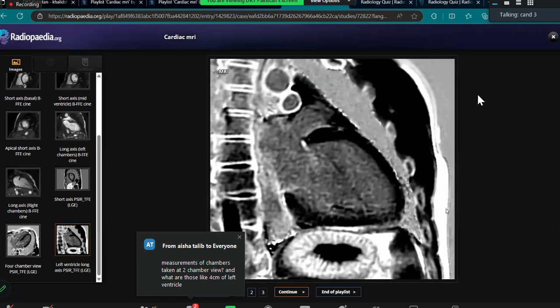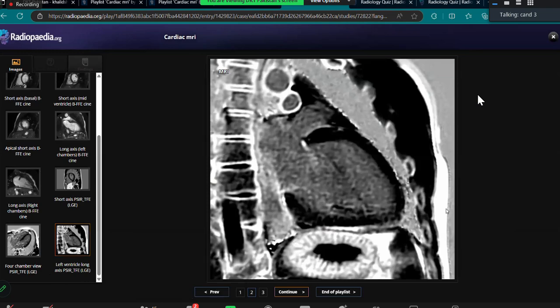As the patient has a dilated cavity and there is no area of enhancement, can we see any perfusion images if available? No, there is no wall motion abnormality. We only see perfusion in case of wall motion abnormality. There are dilated chambers and no wall motion abnormalities. Function is normal as well. So dilated cardiomyopathy may be the cause in this case.